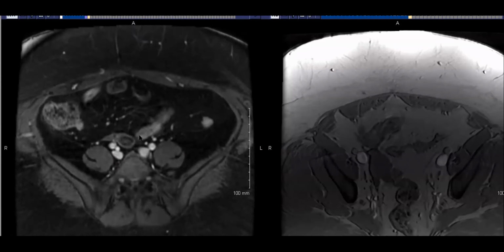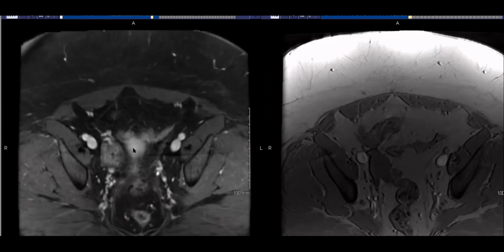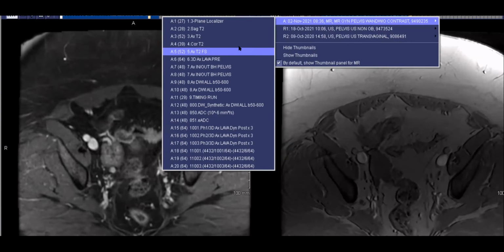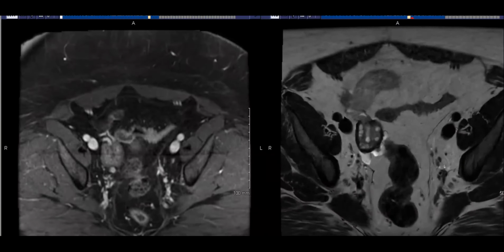So any thoughts? Can you get a T2 dark cortical rim sign in PCOS? There is a described cortical rim sign or something like that. I remember vaguely, but I may be making this up. I don't think it would be that. I know that centrally the parenchyma can look weird, but not like that.